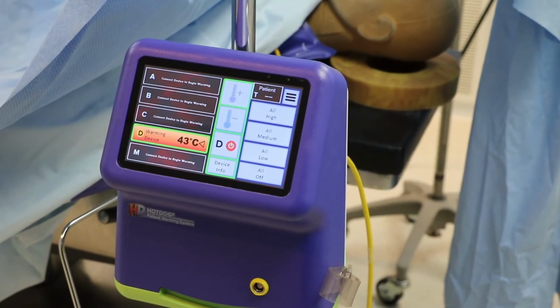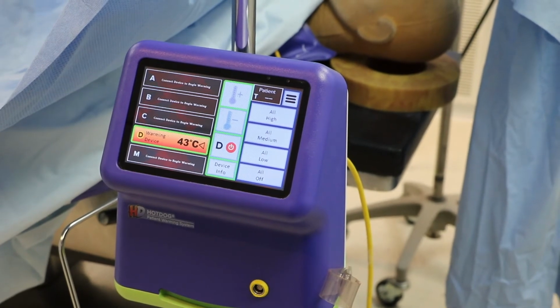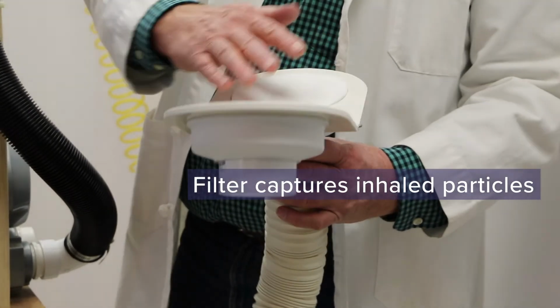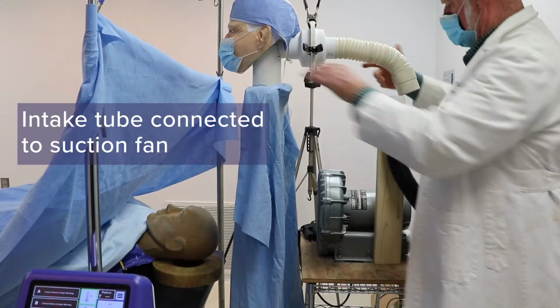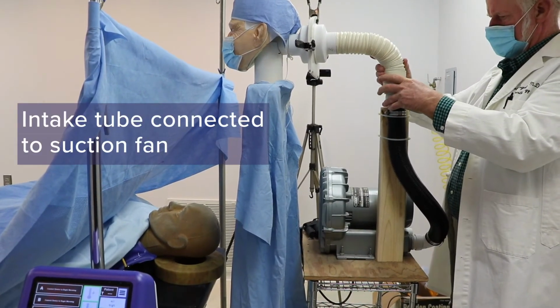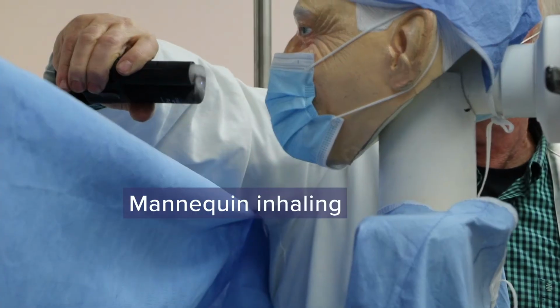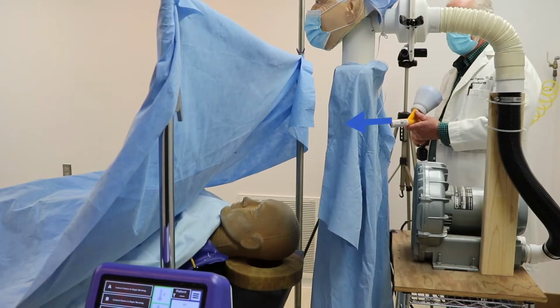The HotDog conductive fabric blanket is warming the upper body on high setting. A new filter is placed over the airflow path to capture inhaled particles. The intake tube connects the anesthesia provider to the suction fan. Again, the laminar flow system is effective, and the inhalation simulator is operating.